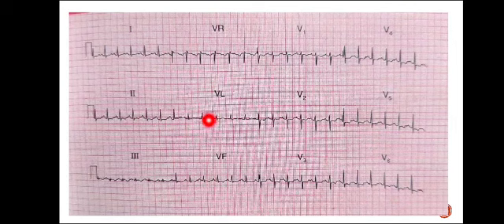In this third ECG, we are able to find P waves. So there's a sinus rhythm, and if you look at the rate, only two boxes, so the heart rate is in between 140 to 150 beats per minute. Lead 1 and AVF both are upwards, axis is normal, QRST complexes are normal over here.